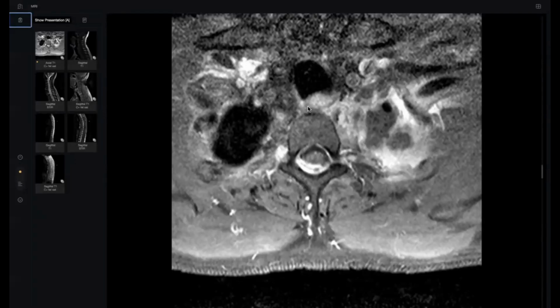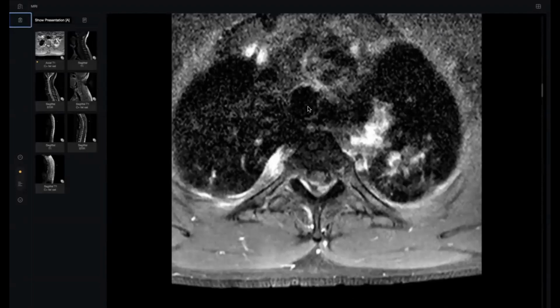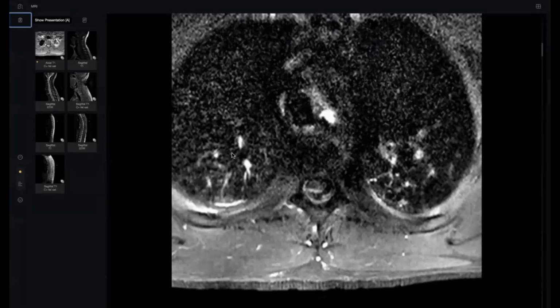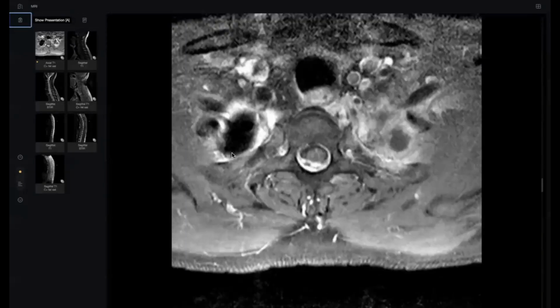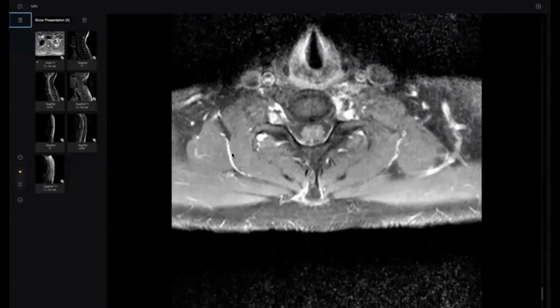I can also appreciate that in the left apical lung zone, there is some heterogeneous hyperintense signal with some surrounding spiculations. There are a few scattered areas of hyperintensity also seen in the right apical region. The left hyperintense signals are tracking along the left apical and posterior margins. They have a cavitating appearance in the center as well. I suspect there are multiple cavities, some of them coalescent.